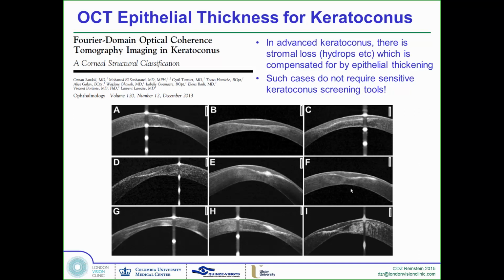And if you just look at these B scans, these OCTs, it's absolutely exquisite to see how the process of nature, the way that the epithelium is designed to behave, restores the stromal surface curvature despite major alterations in the optics of the stromal surface alone. So it's really quite beautiful.